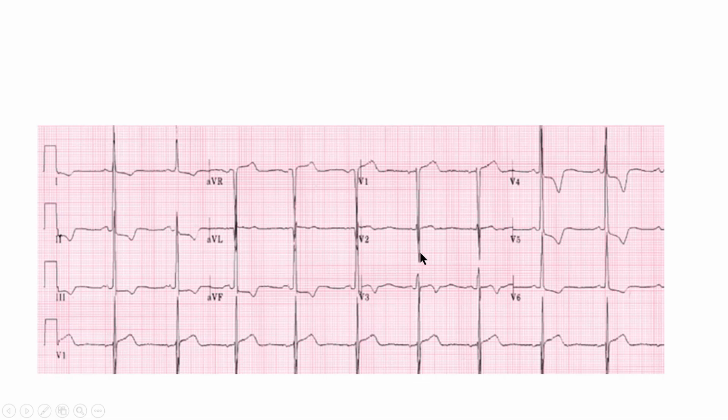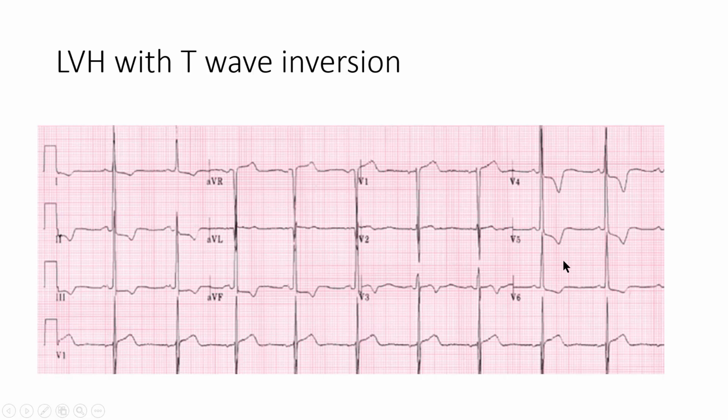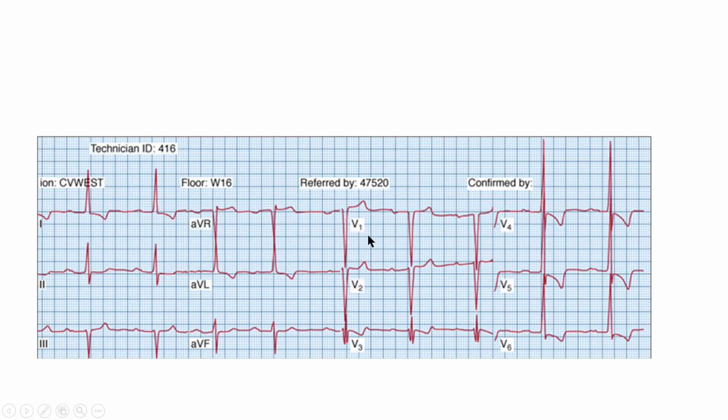We have left ventricular hypertrophy, and then also we have this T wave inversion, which is quite prominent and associated with downsloping ST segments here. So this EKG is going to make it very difficult to assess for ST T wave abnormalities in the setting of chest pain. Again, here in this 12 lead EKG, we can look at V1 and see the negatively deflected component, and then in V6, the positively deflected component easily registers 5, 10, 15, 20, 25, 35, 40, 55, 60 millimeters of increased amplitude. So voltage criteria are definitely satisfied.